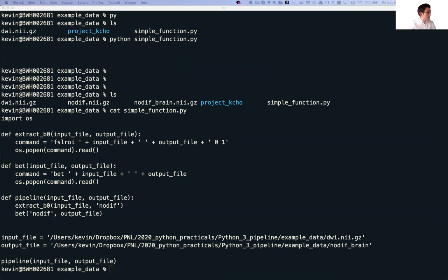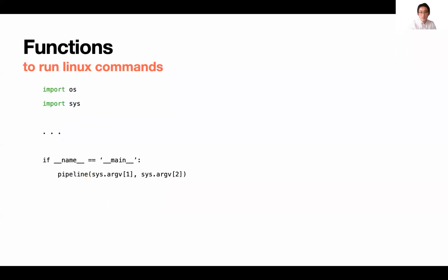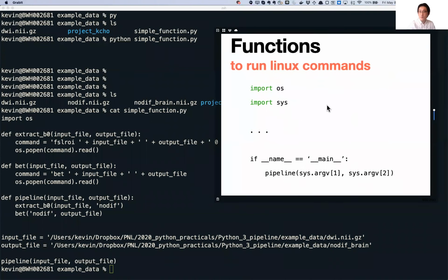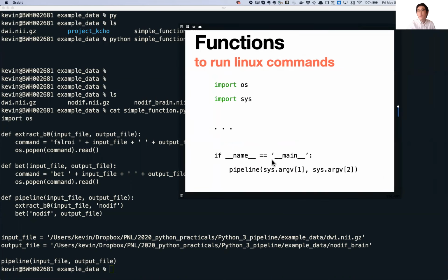That's the simplest pipeline that you can use. Okay. All right. Another Pythonic thing that I have to show you, when you make a script. So from the first lecture, we did sys.argv 1 and 2, get the output.